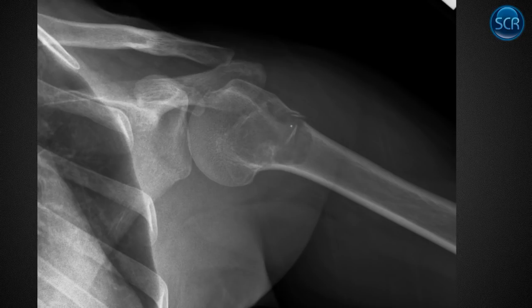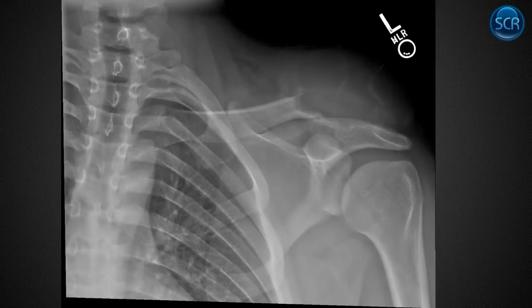Could this be fibrous dysplasia? Sure, but it can't in this specific instance because we have a fallen fragment sign. And another little one over here. All right, so they presented with pathologic fracture, fallen fragment. The only way this fragment can fall in here is if there's nothing in there other than fluid.